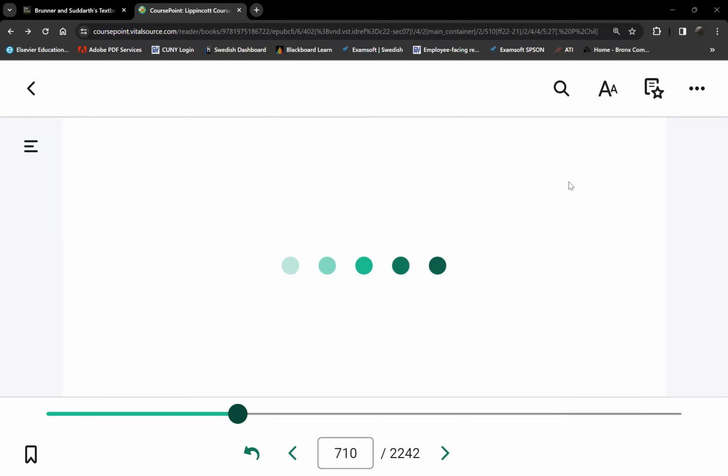Anyway, so in complete heart block here, there is a complete disassociation between the SA node and the AV node. They are not communicating with each other at all. The SA node is firing, evidenced by the P waves that we see. The AV node is also firing, as evidenced by the QRSs that we see, right? But there is no QRS for every P wave. All right, is that clear?